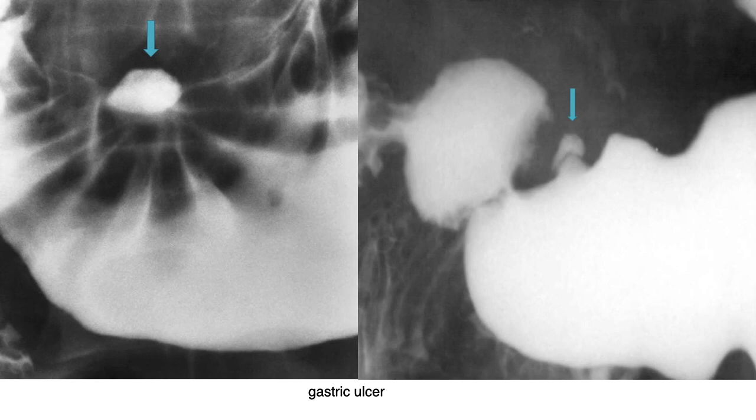Hampton line. So you have to check that out. What is the Hampton line? Anyway, I've made the description after this one. Maybe I'll upload the PDF talking about that. It's very important. You have to know the difference between ulcer and diverticulum, also the difference between malignant and benign ulcer.